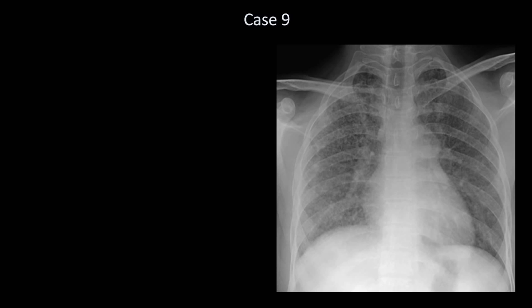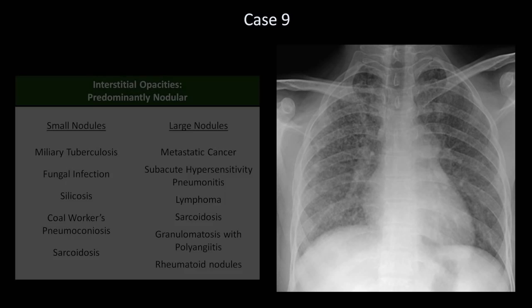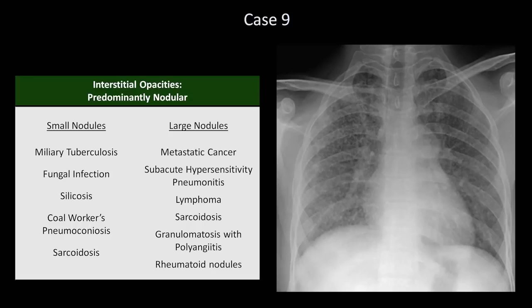What's the differential diagnosis for that? The differential diagnosis is roughly subdivided based on the size of the nodules. In lesson 7, I attempted to place an exact cutoff to the size that differentiates these two categories, but the more I think about it, it's probably too artificial to draw a specific line, and better to leave it more vague as to where the line is drawn between them.